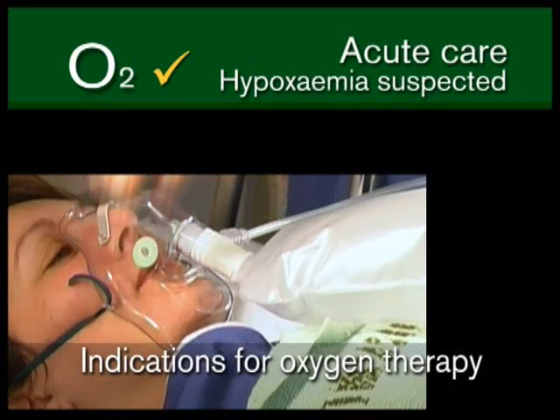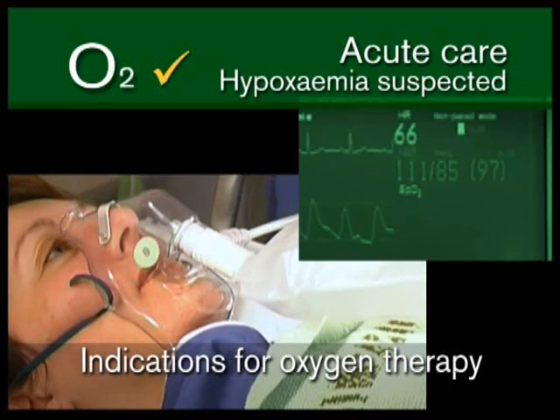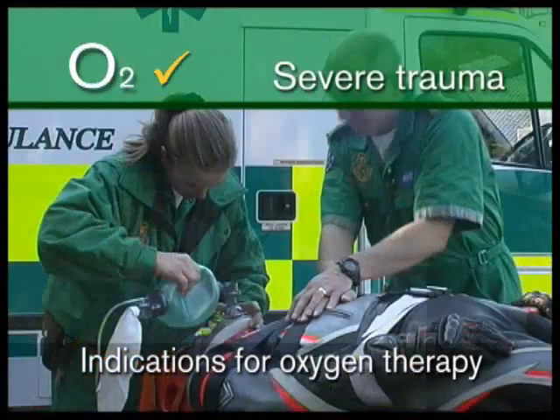In an acute care situation in which hypoxemia is suspected, substantiation of hypoxemia is required within an appropriate period of time following the initiation of therapy.